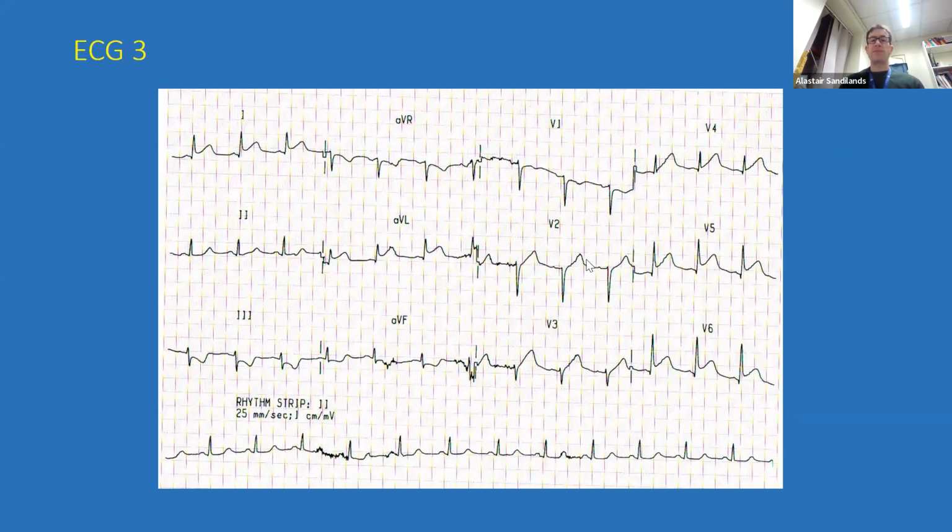Okay, so this example is a bit more subtle. I've tried to put it in, and I think, whoever asked about hyperacute T waves, this is probably an example. But again, you would have to have context. You could say this patient comes in with central crushing chest pain, or central severe chest pain going down the left arm, and then you're heightened towards the fact, okay, I've got to look for any ST T wave changes.